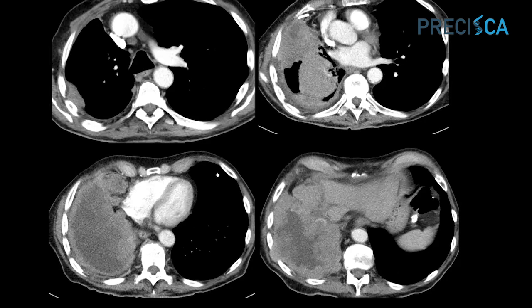Now, what I'd like to also point out is a very obvious finding that I find kind of irritating because it's so easy to look over. And that is the size of the thorax. The left side is so much bigger than the right. But if you don't make a conscious effort to look at the two different sizes, it's so easy to walk over that. So this volume loss is another secondary sign, very useful in making the distinction.